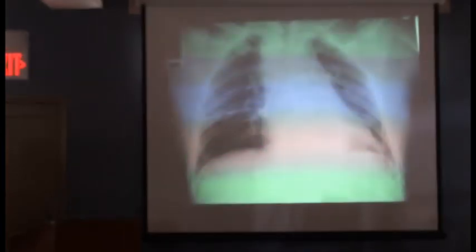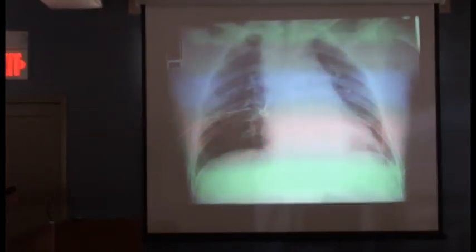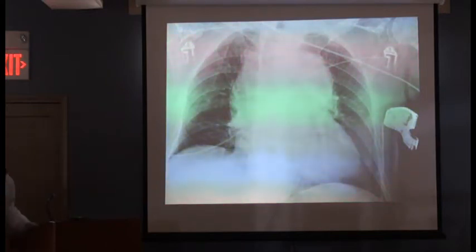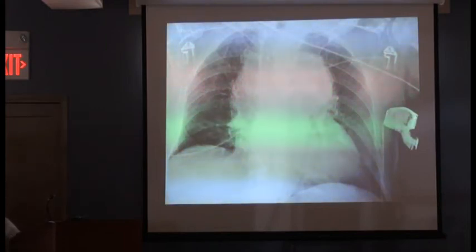Okay, what's this? Exactly, the chest tube. Now, what I would do if I had more time, I'd pick one of you, probably Claire because she's not paying attention, and I'd do ABCDs. And I could do ABCDEs, and when you get to the E's, everything else, you'd notice that there's a chest tube in here. All right? Good. That's E, everything else.